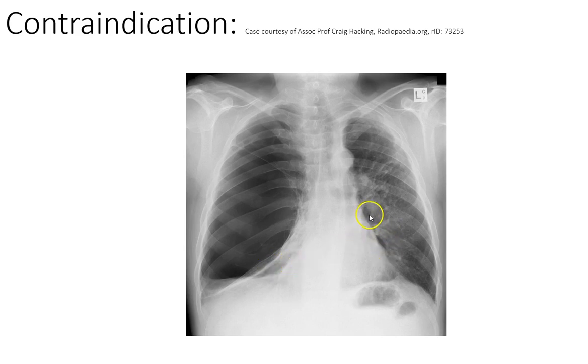On this side, there could actually be some other bullae, and the lung in here, you can see those. This is much more how often it can appear, like these black darkened patches. So this is what you're more often looking at, this patch here. But here we've got one massive bulla popped, but it's not caused a pneumothorax, but the risk is that it definitely could do. So again, I wouldn't use any positive pressure techniques.